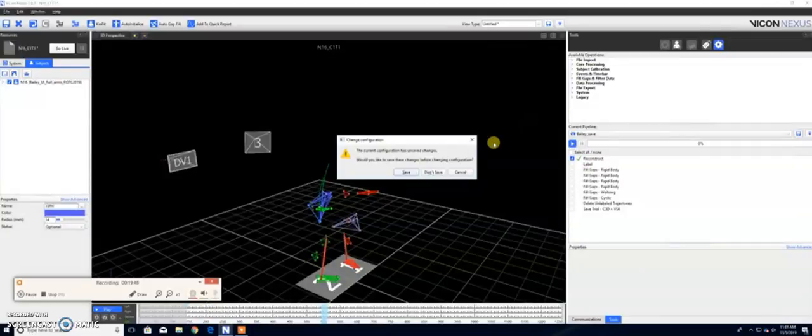And so when we run it through this pipeline, the goal is to delete any markers in the environment that aren't labeled. And so this eliminates some of those ghost markers from showing up in our trial, especially when we move it to process a little later on.